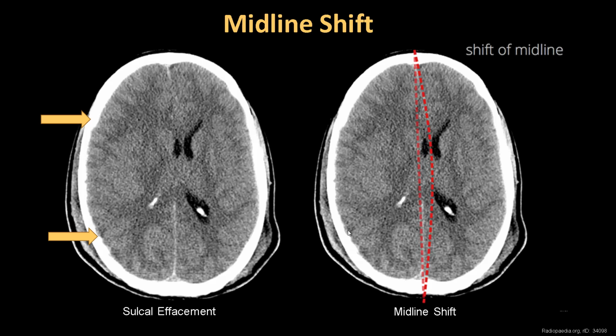I'm assuming that there's a bleed in this patient. There's some irregular hyperdensity here, which I might be catching a part of a bleed. There's some soft tissue swelling on either side of the brain. So there's probably an underlying bleed, which they're only catching a very small part of, which is causing this midline shift in this patient.